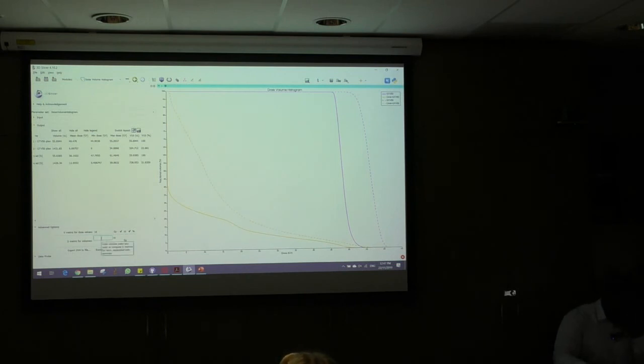And you can calculate some of the dose metrics as well. So you can calculate the minimum dose to, for this particular metric, the minimum dose in the 10 cubic centimeters of the volume receiving the highest doses. And you can see it's updated once you click outside. And you can also calculate the X percentage, so let's say 2%.